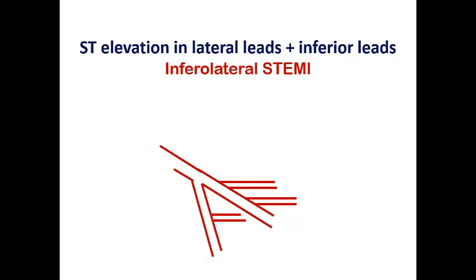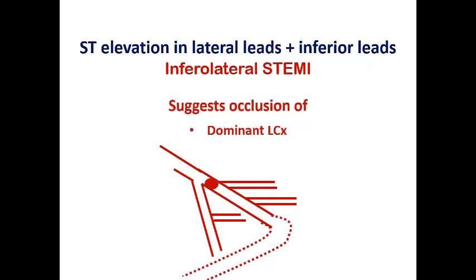Another possibility is ST elevation in lateral leads plus the inferior leads, which we call infralateral STEMI. Here, of course, this possibility raises the suspicion of a dominant LCX, and there is occlusion in this dominant vessel, resulting in lateral wall and inferior wall infarction.